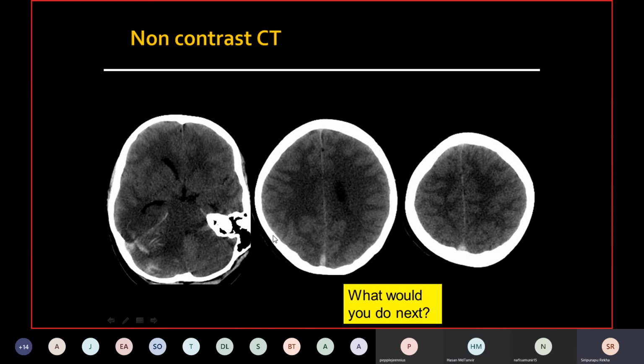Okay, so what we're seeing here is hemorrhage within the cerebellum. Again, remember the patchy, variegated pattern of hemorrhage. Because this is a posterior fossa hemorrhage, there is mass effect, the fourth ventricle is completely gone, and all the posterior fossa cisterns are effaced. And remember, there is an upward transtentorial herniation. We've got a little bit of chubby cheeks going on here because of the hydrocephalus.